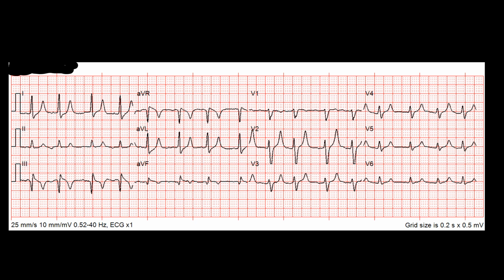Actually, you can see in lead 3, if I'm scanning it for acute MI, I see Q waves, I see that convex ST shape with some ST elevation. I even have what appears to be reciprocal depression in AVL. So you might be thinking inferior. However, this patient's potassium was like 8.1 or something like that. And the ECG normalized after we gave treatment to the patient.